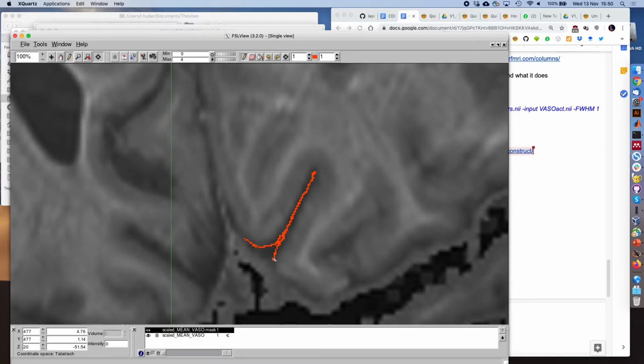So I try to be as conservative as possible and just draw the borderline above gray matter, let's say if we have gray matter here, then this is smoothed out with a finite resolution. Then I would draw my borderline here where it goes to 0.